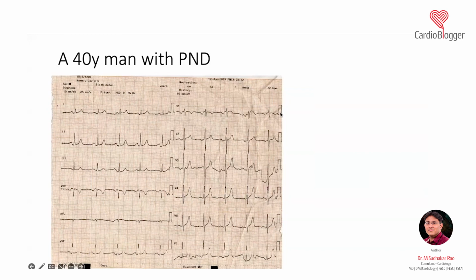However, when you come to the left atrial enlargement, it's not called hypertrophy. Left atria is usually enlarged, whereas the left ventricle can be enlarged or hypertrophied, which we will come to. Left atrial enlargement produces, as I told you, a bifid P wave in lead 2 and a negative deflection in lead V1. The Morris and Macruz index will be positive.